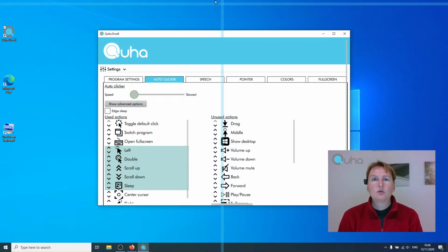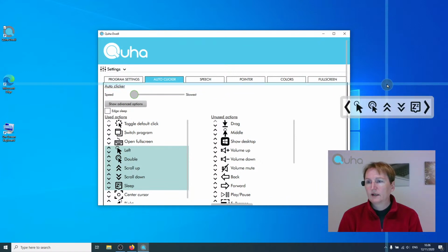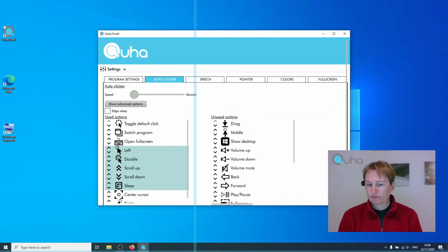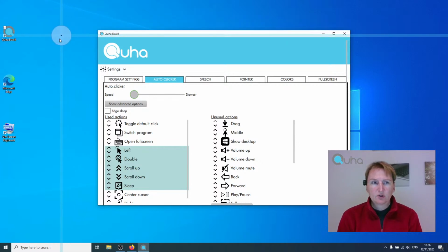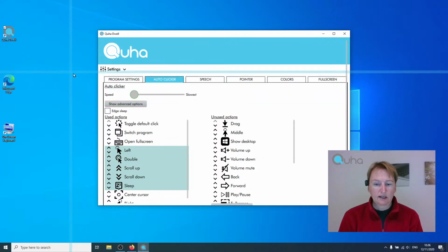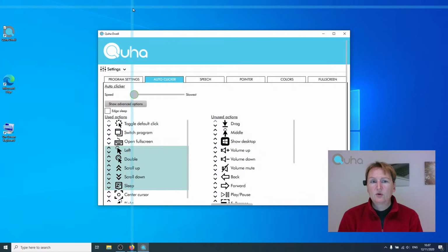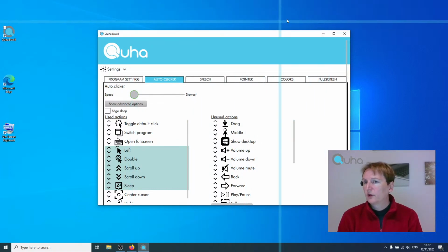But basically this menu pops up every time you stay idle or dwell somewhere for a while, and those delays can be set. You can see the crosshair here. It is on by default, so it is easier to pinpoint where the cursor is located. If you don't want to use the crosshair, you can turn it off in the settings.